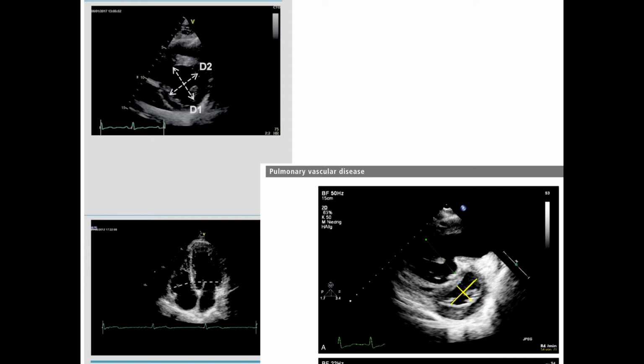A right ventricular abnormality is defined as either right ventricular enlargement, that is, the basal width of the right ventricle approximating the left ventricular width, or the presence of septal flattening. Visually, basically, it is just a definition of the minor axis of the left ventricle in the plane that is parallel to the septum being greater than that perpendicular to the septum, such that the eccentricity index exceeds 1.